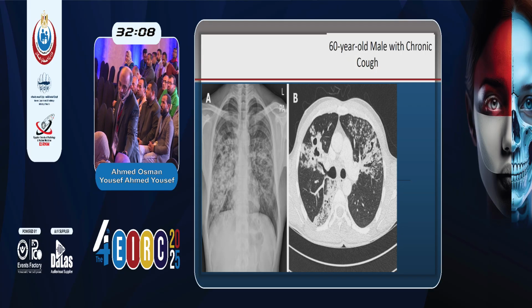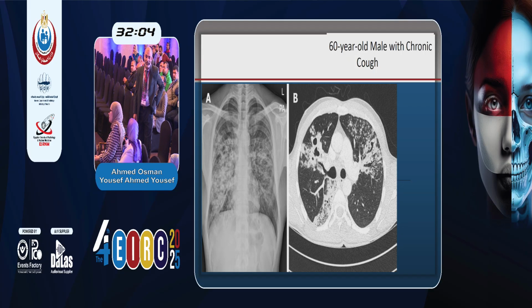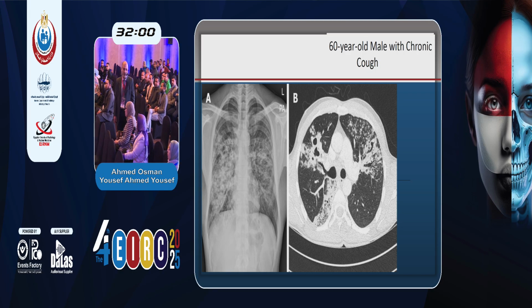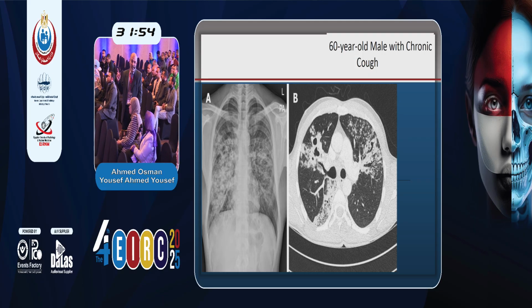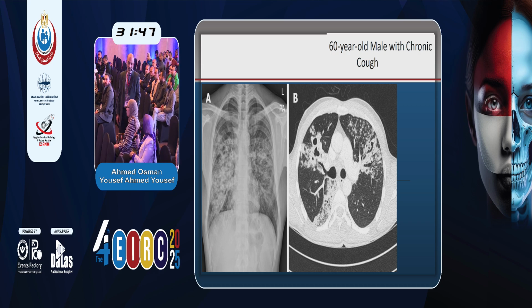What do you think about active TB? Cavities in the upper lobes with tree-in-bud. Yes. Tree-in-bud means what? Endobronchial spread. Yes, endobronchial spread. But is this active TB or could it be reactivation TB? I don't see old fibrosis. I don't see fibrosis. Active or reactivation TB? Active. I don't see signs of old TB.